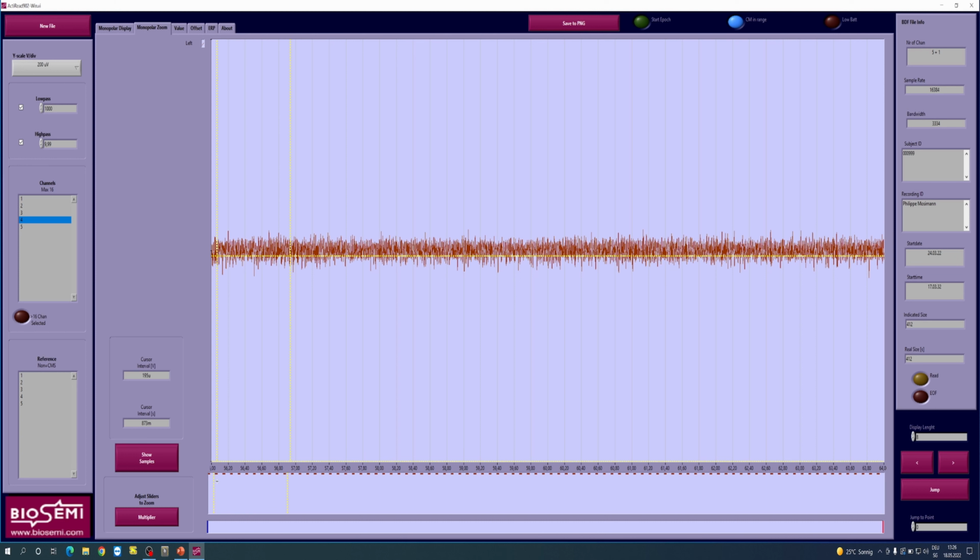In fact, if we had 16 bits incoming, we would have 16 colors going from top to bottom. Remember, the first half is the low byte section, triggers 1 to 255. And the second part of this screen is the high byte section, trigger marks 9 to 16, respectively 256 to 65,000 and something.